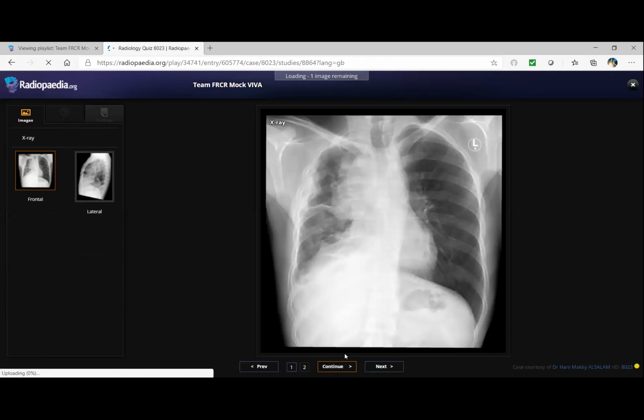Yes. Okay. This is your next case. Yeah, this is the frontal radiograph chest of an adult patient, where I can see diffuse abnormality involving the right hemithorax with volume loss of the right hemithorax, with elevation of the right dome of the diaphragm and tenting of the diaphragm. There is some thickening of the horizontal fissure also.